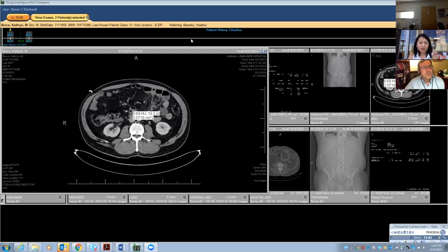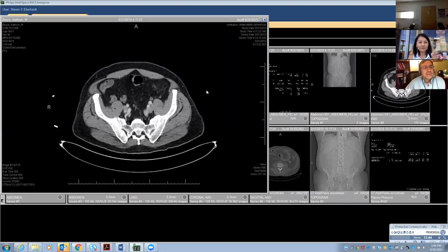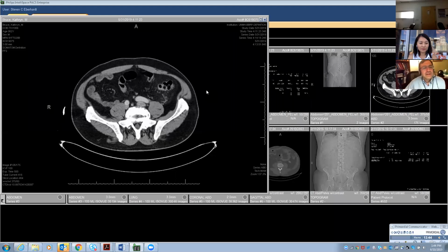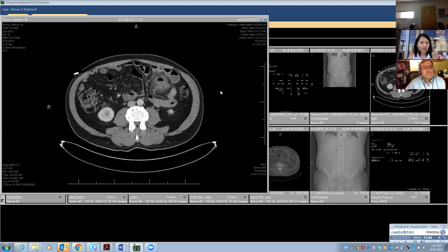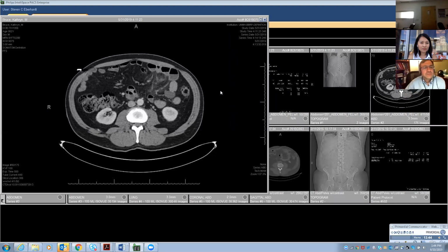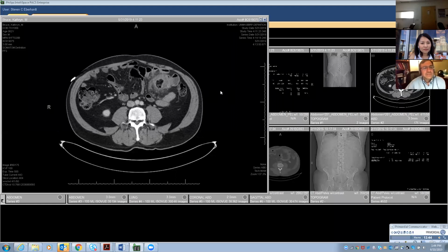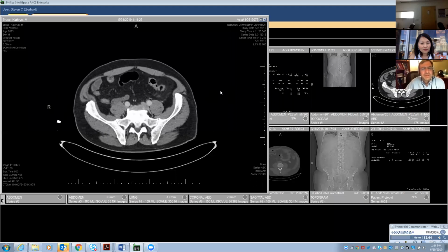It was an abdominal pain, low-grade fever, ED case, an anonymized case with a fictional name and MRN. So here are some findings in the mesentery and bowel. And for me, this is kind of a differential and not a diagnosis, but I found the availability of the prior imaging helpful.